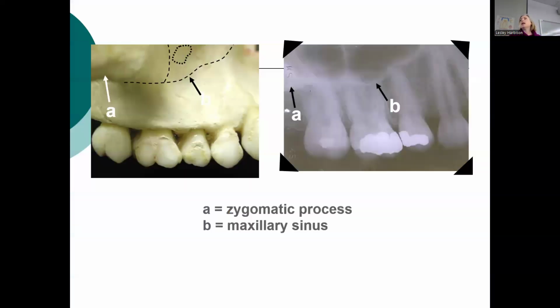So see what it looks like. This is a hard one. I would probably not use this image on an exam, but see how it gets kind of thicker and whiter back here? Whiter, not wider, W-I-D-E-R, but also whiter. So that lets you know that this kind of thin part is the floor of the sinus. That's all the open cavity. And then it gets a little whiter and whiter, and so that's a little bit of the zygomatic process. I don't like that picture for a test, but that's what it is.